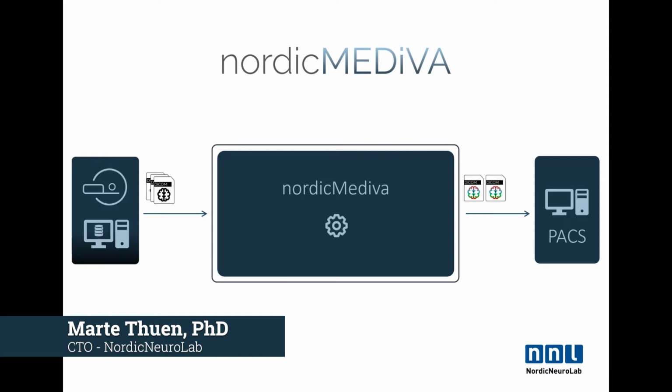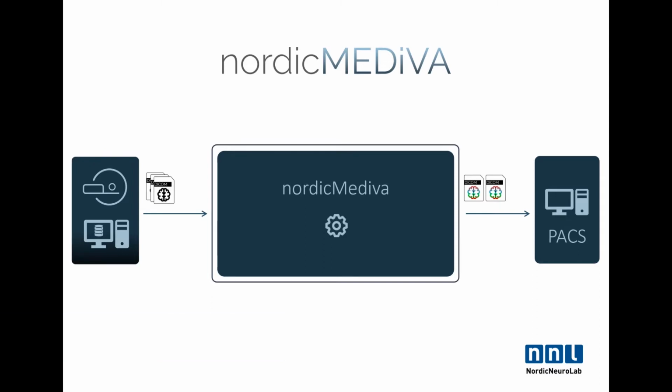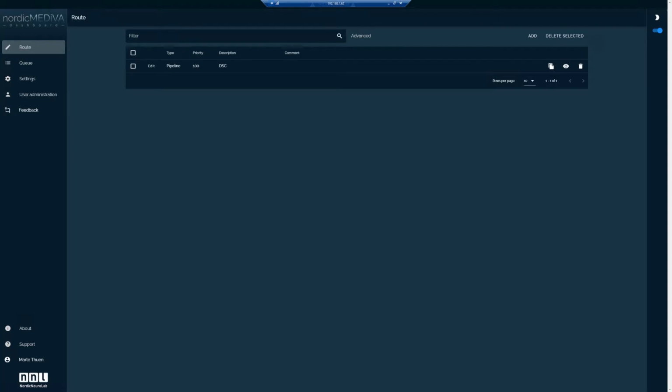So I will now show you how to operate the nordicMEDiVA dashboard. And as you remember, data is sent from the MR scanner or from PACS into the nordicMEDiVA system, where it's automatically analyzed, and then the results are sent to PACS. The nordicMEDiVA dashboard is a web-based system for configuration of the nordicMEDiVA platform, meaning that it can be accessed from any computer.